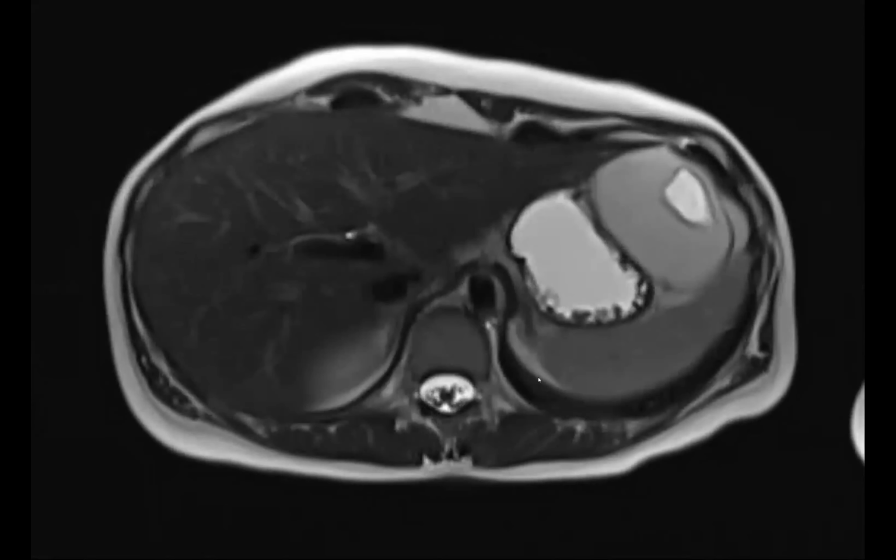Sorry, did you say that T2 bright area is a scar? Yes. Aren't scars dark on T2? They usually are, but in hemangiomas, they're brighter. I don't know if scar is the proper term. Maybe let me Google this, but it looks cystic. This is the classic appearance of the center. I believe you. I'm just trying to make sense of the T2 signal. Let me see what the proper name is for it.